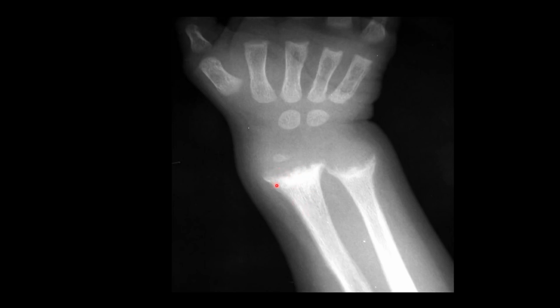Now because the bones are weak, when there is weight bearing on the bones, they splay out, they spread out, that is, there is splaying. So there is splaying and there is cupping. This concavity here is the cupping. This flaring out is the splaying, and the irregular margins, that is fraying. So the signs of rickets are fraying, splaying and cupping of metaphysis with widening of the growth plate.